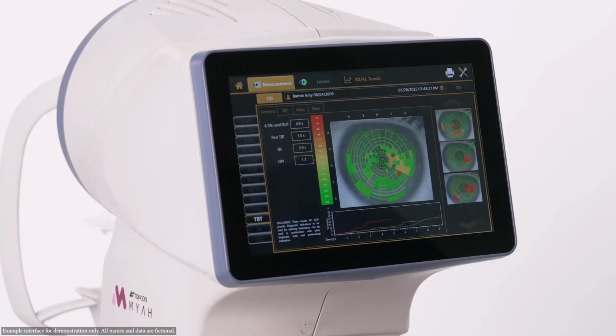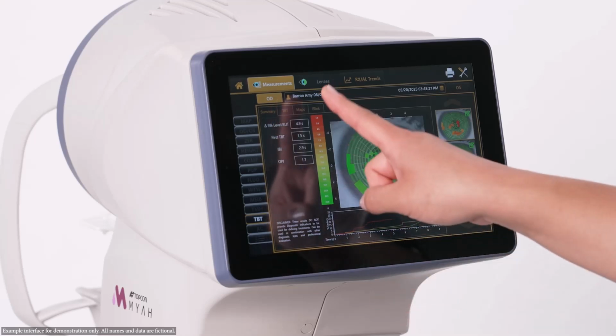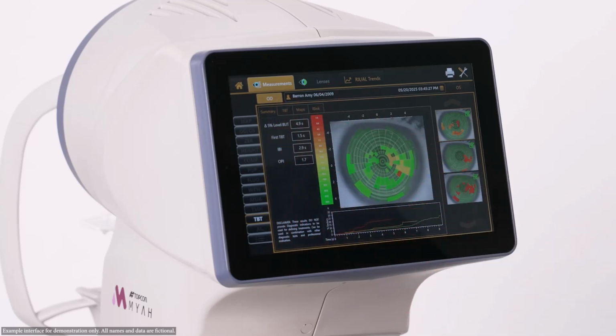The Summary tab is the default and displays metrics based on a combination of all selected tear breakup acquisitions, along with the Blink analysis data if this was also assessed on the same date. The map shows the corneal surface divided into sectors, with color coding to indicate the time in seconds after a blink for the tear film to break up. Hotter colors indicate a shorter average breakup time for that segment, with the time scale shown down the left side.